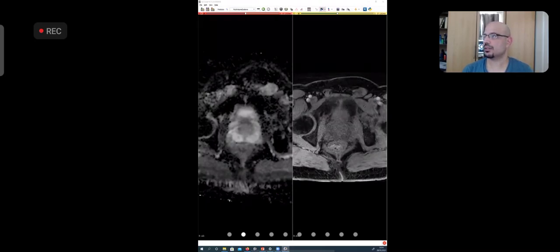आपको पता चलता है कि यार phase क्या है, कितने seconds गुजर गए, arteries, roughly 30 seconds span. Femoral vein में अगर contrast आ गया, then you can tell, I'm not exact about these figures, so, maybe 90 seconds or so, and so on and so forth. But interestingly, you will see कि यहाँ पे enhancement नहीं आई. थोड़ी सी blush है bilateral, लेकिन ये कोई bulb नहीं इधर light हुआ.